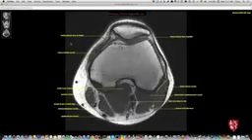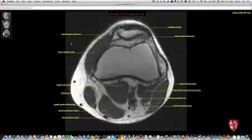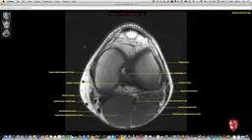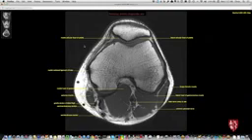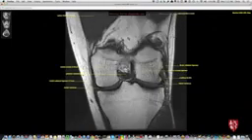So that's always good. When you're learning MRI anatomy, I think the best way to do it is just to sit down at an interactive site or viewer, and you may need an anatomy book or a site like this to really know what the anatomy is, but go over the anatomy in great detail, because in MSK, that's really what we do all day: look at anatomy and then look at derangements of anatomy.